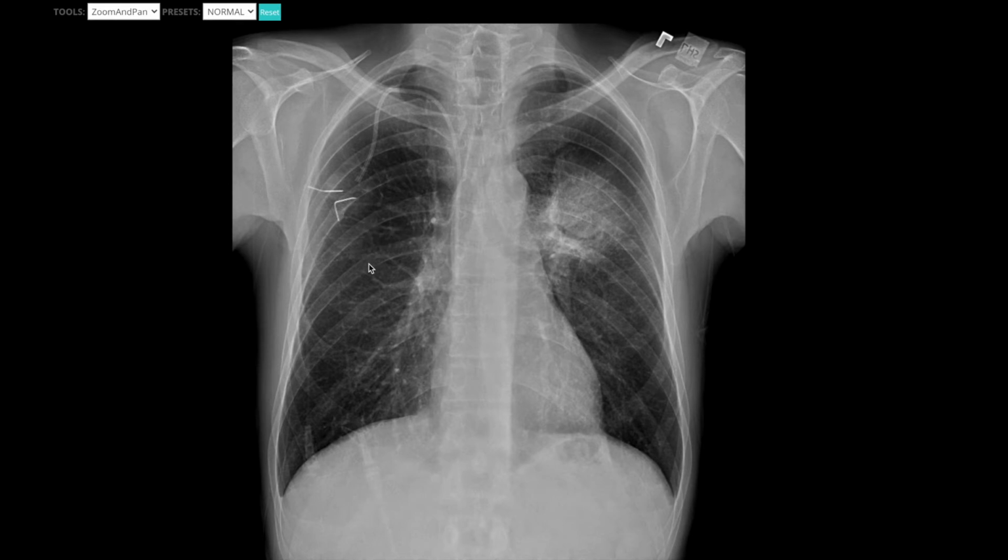What you'll see farther out, you can see peribronchial wall thickening. You can see thickening around the airways, or blurring of these vessels going out farther, and that may indicate other things like airways disease or edema or things of that nature. So more peripherally, you can really get a good sense of airways disease or pathology within the airways, but centrally it's going to be those main few things.